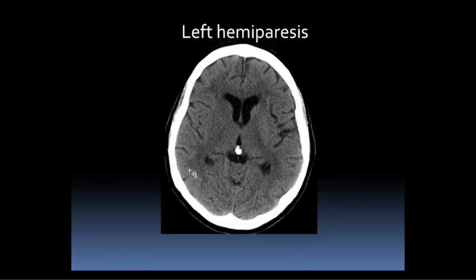So in this case, can you guys find the stroke? Well, you also know which side the infarct is on, so it makes it easier. But what's the finding here? Anyone just kind of shout it out if you see anything that looks possibly abnormal. No points deducted for wrong guesses.